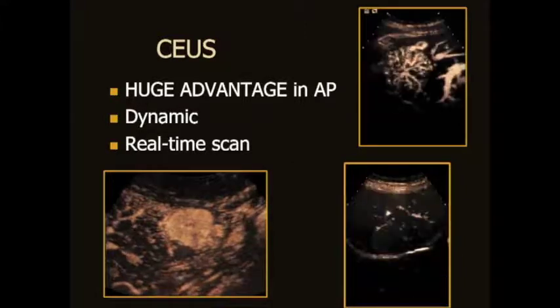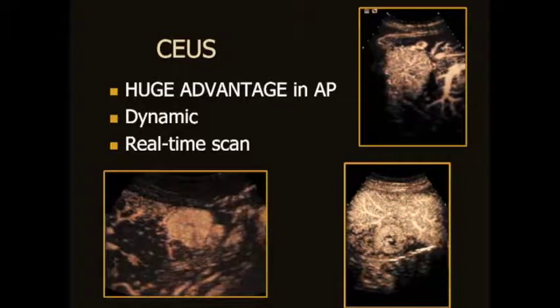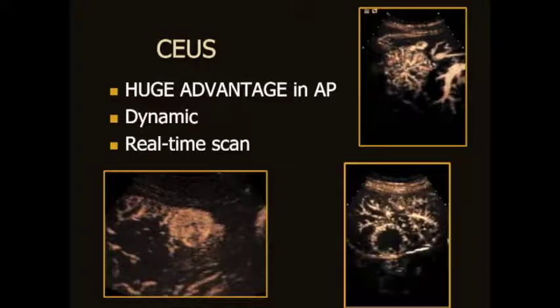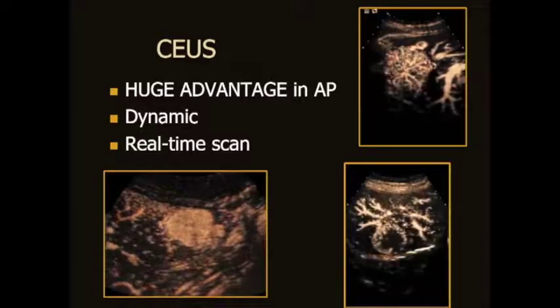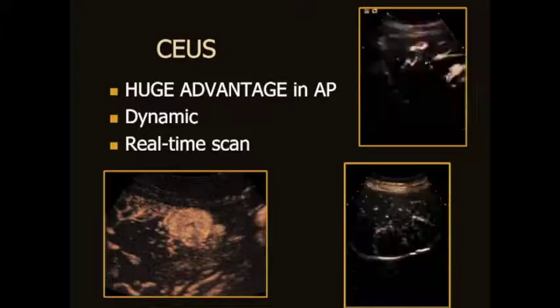So the upper right lesion is obviously the easiest of them all, where we can see that bubble tracking technique showing the stellate vascularity and the centrifugal filling. The lesion on the bottom with the peripheral puddles proceeding to the center of the lesion, and the lesion on the bottom left showing a centripetally filling mass lesion from the periphery to the center with a more chaotic vascular pattern.